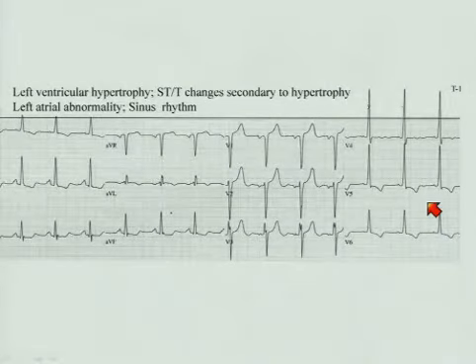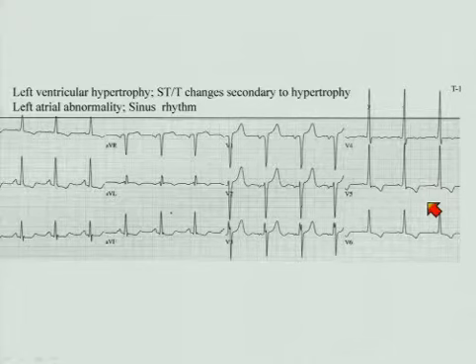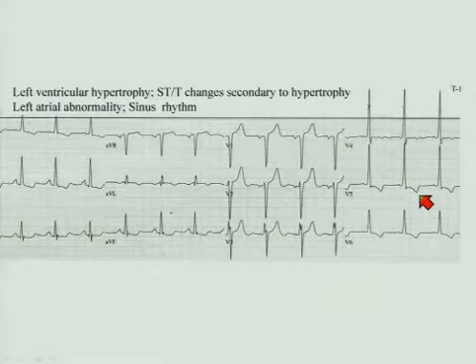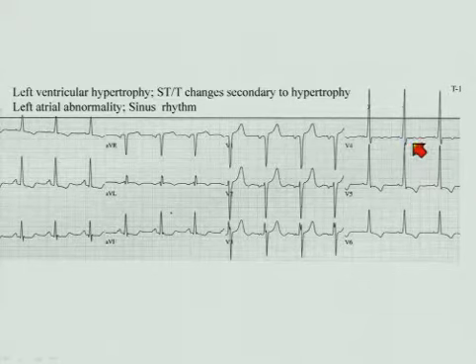Let's talk about some electrocardiograms, and let's begin with straightforward LVH, left ventricular hypertrophy. You see it every day and know readily how to identify it, characterized by increased voltage, and the diagnosis strengthened by the presence of secondary STT wave changes, often the left axis and/or left atrial abnormality, and intrinsicoid deflection prolongation, classic left ventricular hypertrophy.